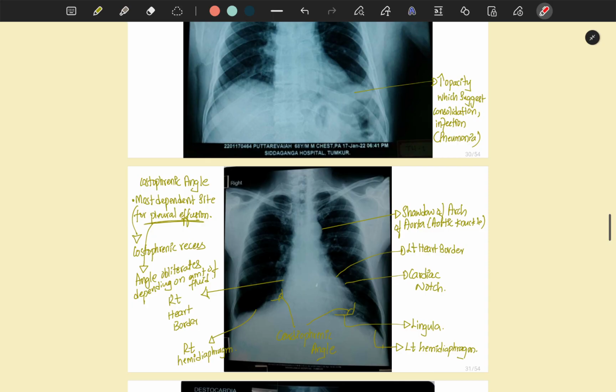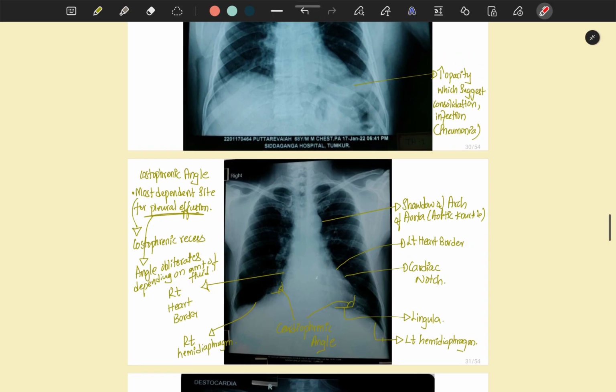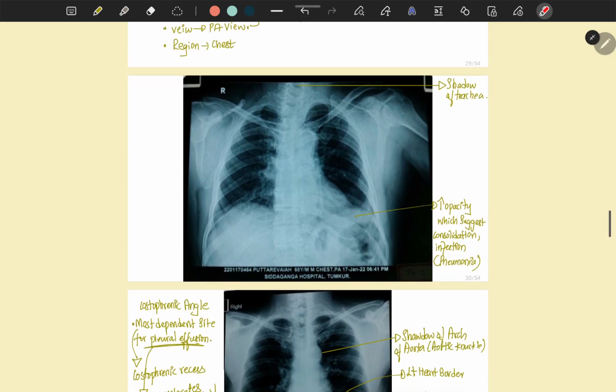And coming to the next X-ray, here you can see, coming to the breathing and bones, bones also you are prominently seeing: the scapula, glenoid cavity, clavicle. This is coracoid process, acromion process, and you can see the ribs, and sternum also somewhat visible. This is the head of the humerus, right? This is the upper shaft of the humerus. These are the bones visible.